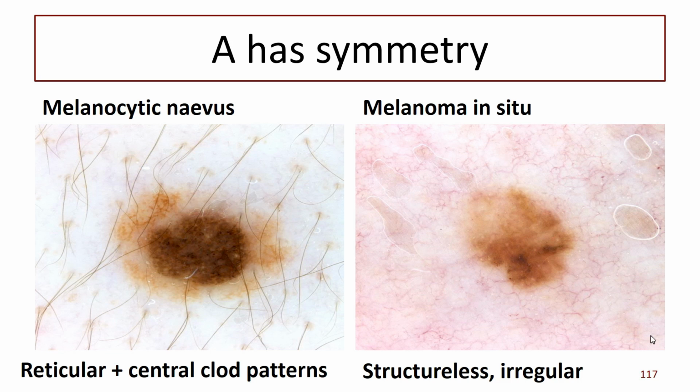You see how there still is a structure there, but it's lost its pigment. So these melanocytes in this portion are no longer producing melanin. And this is tiny. All the lesions that we were seeing today are at the same magnification, but this is an early melanoma. So don't worry if you miss it. It'll still be there next year for you to catch next time.